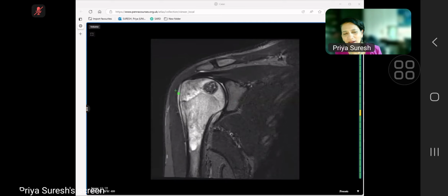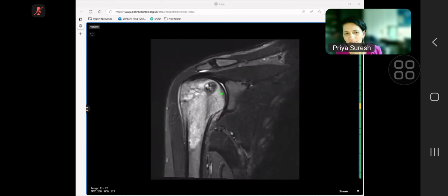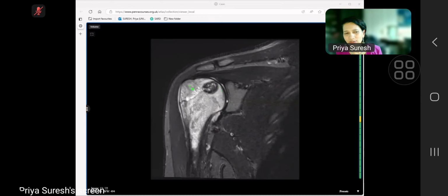It can have intense marrow edema, you're right. It can also have intense effusion, and so people mistake it for infection, thinking, oh, effusion, marrow edema, it must be infection. But chondroblastoma can have that kind of reaction. So well done on the MR. I mean, very, very well done, because many people have misinterpreted this.